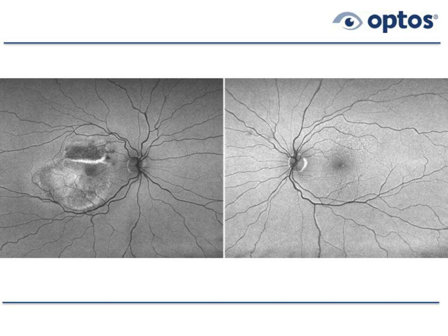This patient was, of course, treated with anti-VEGF injections, actually within about 12 hours of the time that we made the diagnosis of the patient being wet in the right eye. The patient went on to develop wet mac degen in the left eye, and we have this whole series documented with autofluorescence and with OCT. This patient, by the way, we did genetic testing on, and there were some genes that were abnormal, complement factor H high-risk alleles, which is not atypical in such a case. Unfortunately, the patient continued to smoke, and even that increases the risk of developing serious mac degen by about a factor of 3 or so. So we think that was part of the whole problem.